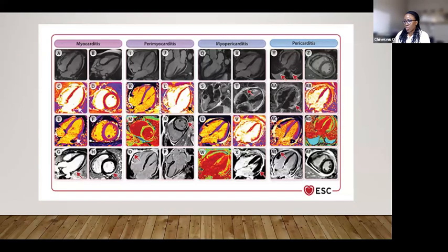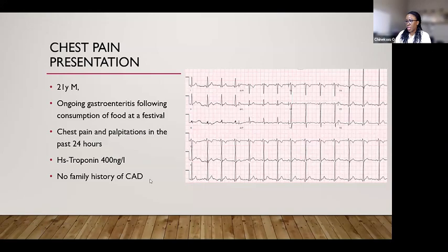And basically, this is what we see in different disease conditions. With myocarditis, we would see that there is elevation; these are T1 maps, these are T2 maps, and late gadolinium imaging, and we can see that. But we'll see some patient pictures that tell the story.